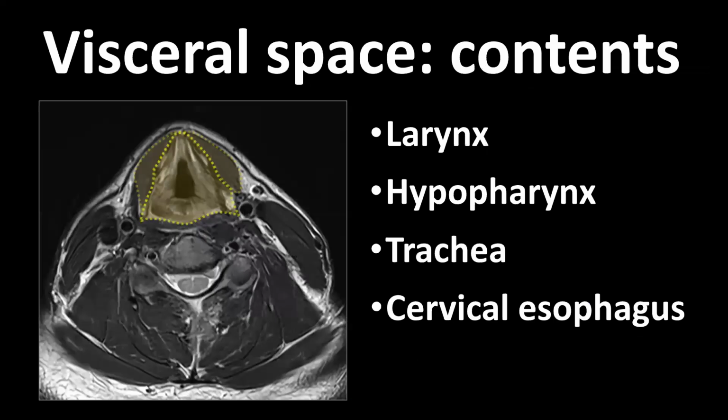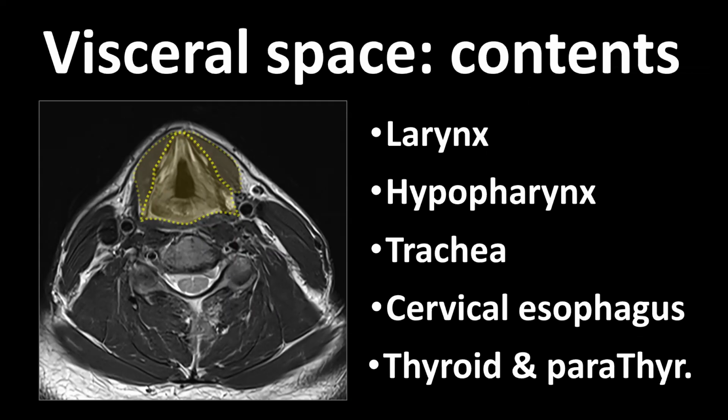Let's now talk about the visceral space. Its contents are well known. Belonging to the visceral space are the larynx, hypopharynx, trachea, and cervical esophagus, but also the thyroid gland and the parathyroids.